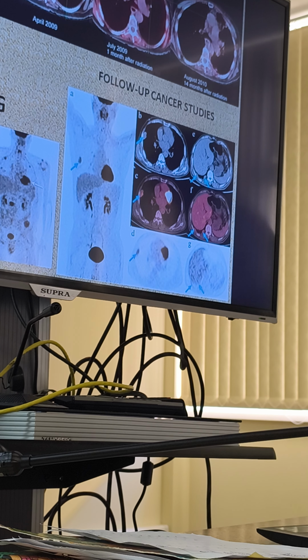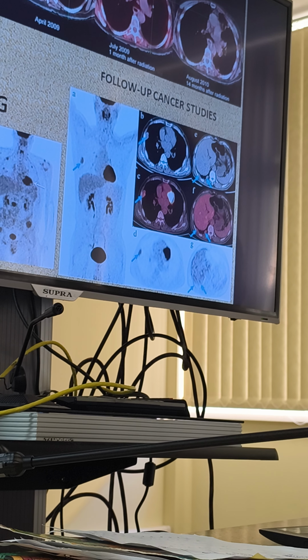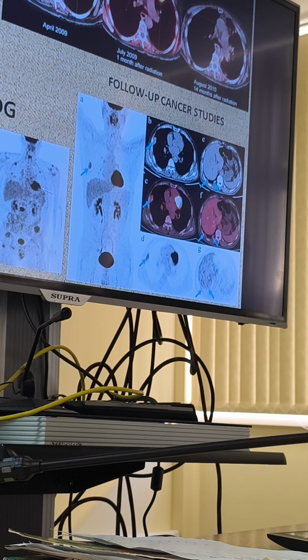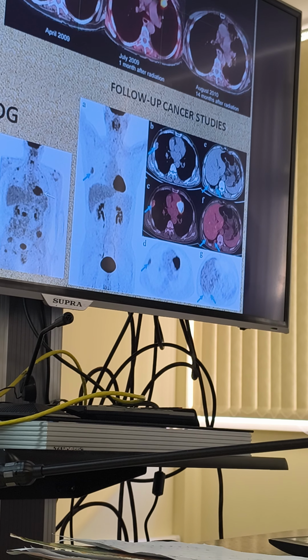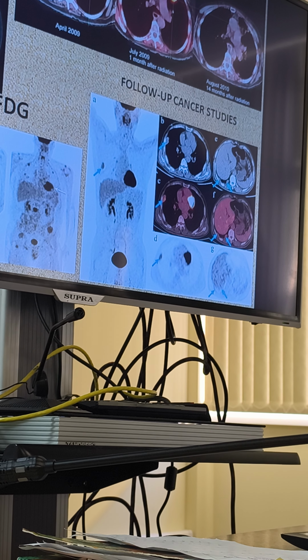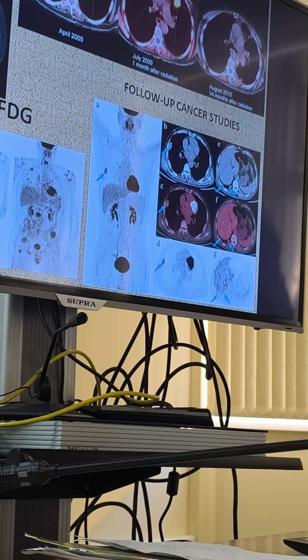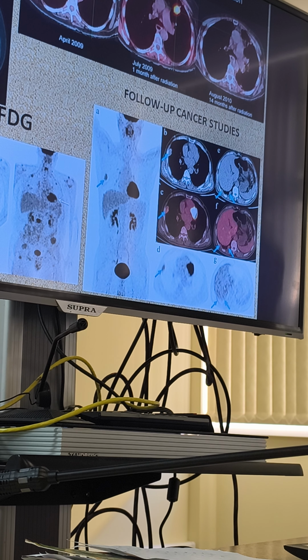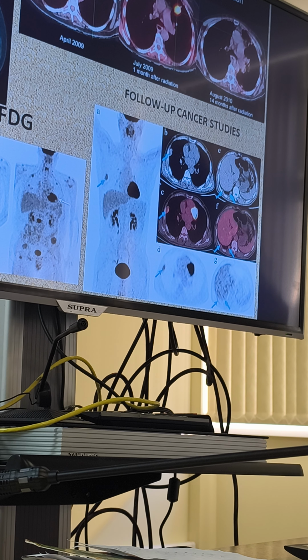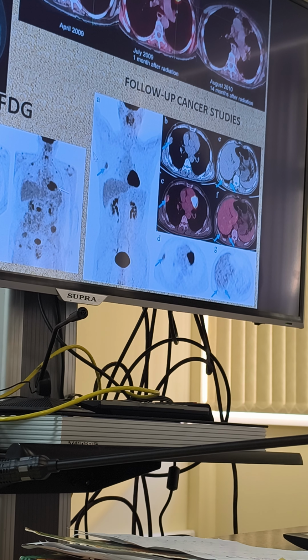Okay. So this is a patient with thymoma, and actually everything seems to be good. The treatment was completed, and there were 5 years of what we name survival without any signs of the disease. And 5 years later, at the next screening study, and this is a good screening technique, because we can have information about the body from one study, and what appeared, we found something. So this is a new lesion, and it appeared to be metastasis.